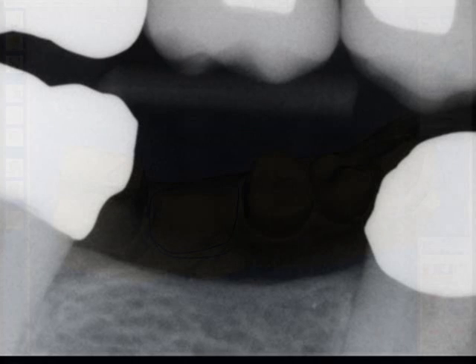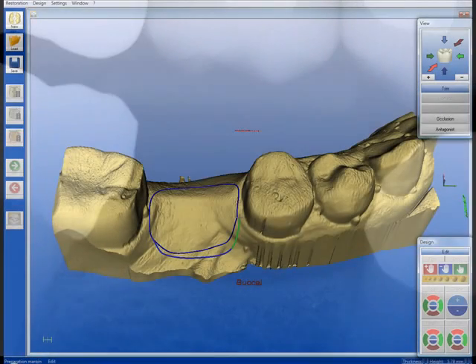This is Dr. Merzine from Aesthetic Dentistry, and I'm going to showcase a patient that was missing a tooth, a lower molar, and as you can see there's a bit of a space between the teeth, and we're going to design this whole case in 3 dimensions.